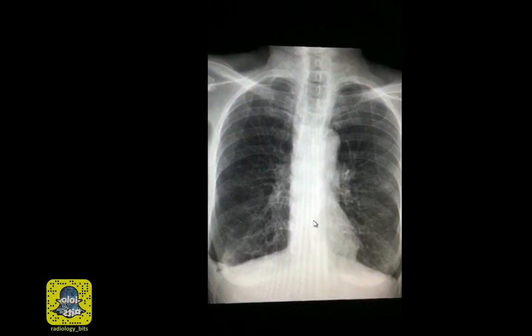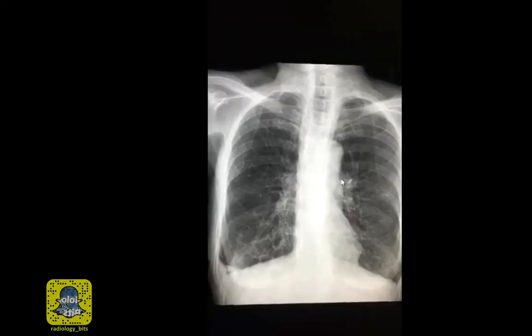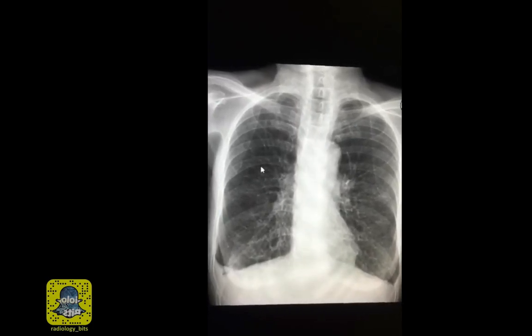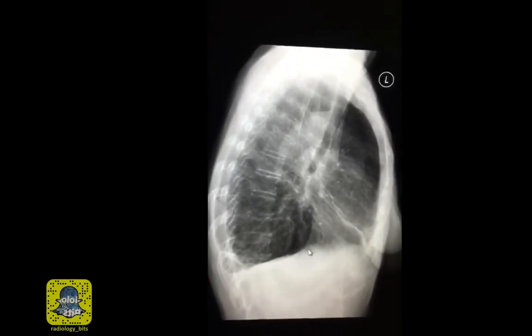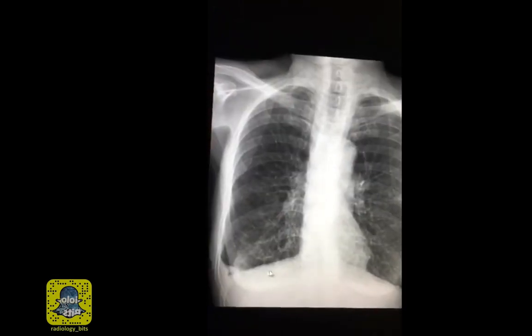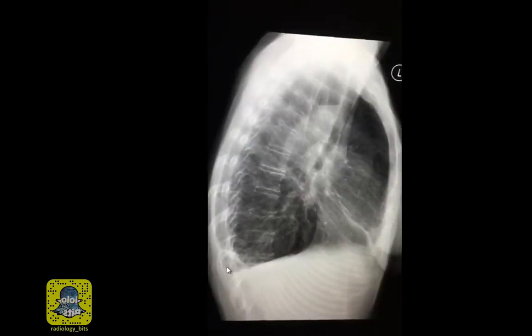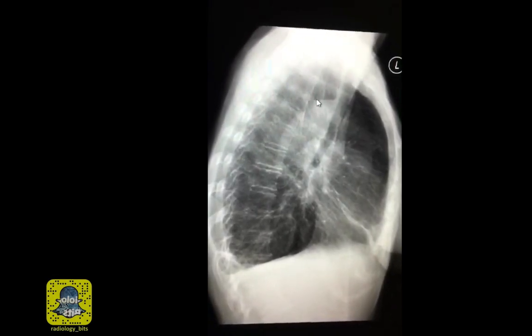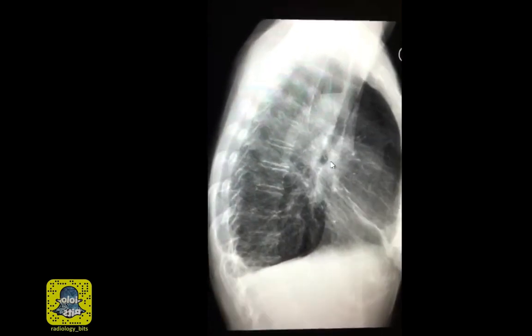So let's summarize what we learned today. Knowing what we know, everything now makes sense on the chest x-ray. From the chest x-ray, we knew that hyperinflation, increased lucency, simplification of the lung, and flattening of the diaphragm are signs of emphysema. And by that, we knew the patient is a smoker. We also knew that the patient has a small right pleural effusion seen on both frontal and lateral. And the most important teaching point is to look for fluid levels. They are not normal. They denote that that space contains air and fluid.